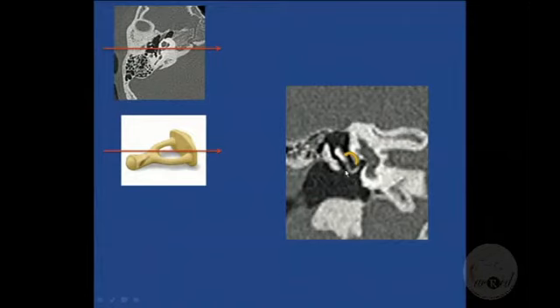So always make sure that you have a gap in the true coronal plane. So a 90-degree stapes and some lucency just before it hits the oval window. But make sure that you are in the right plane. Don't overcall it, because sometimes the section can go through this limb and then through one of the crura. So make sure that you're not on that oblique plane, but on the true plane.